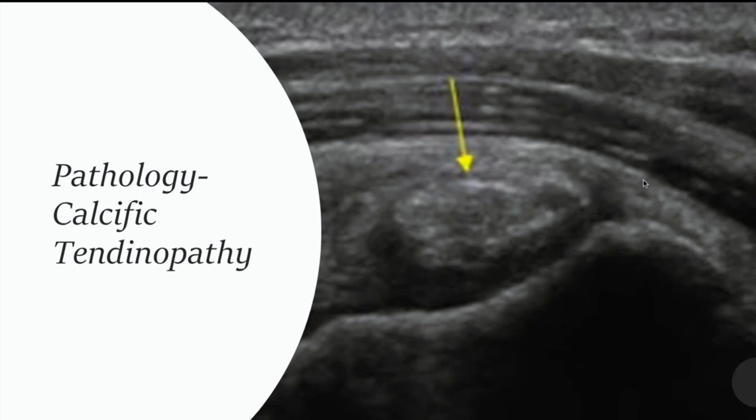Because of the calcium deposition, you may or may not see some posterior acoustic shadowing. Symptoms are largely due to mass effect, which can lead to impingement, limit abduction, or the mass can actually extend into the bursa, creating acute pain. Next slide.